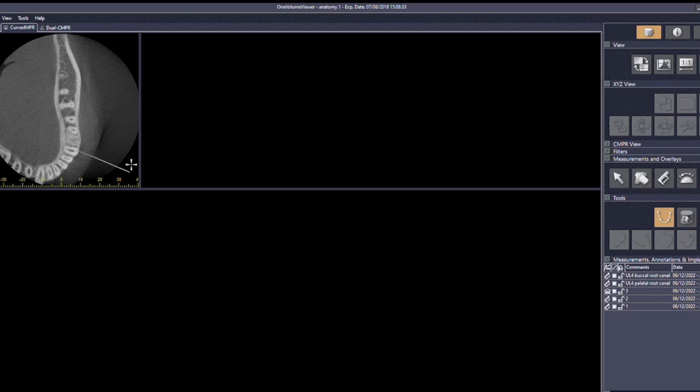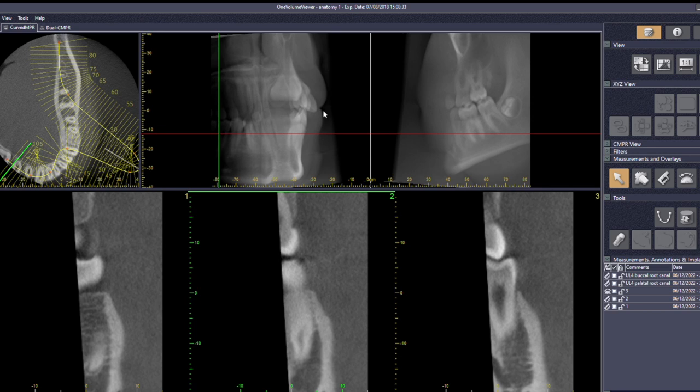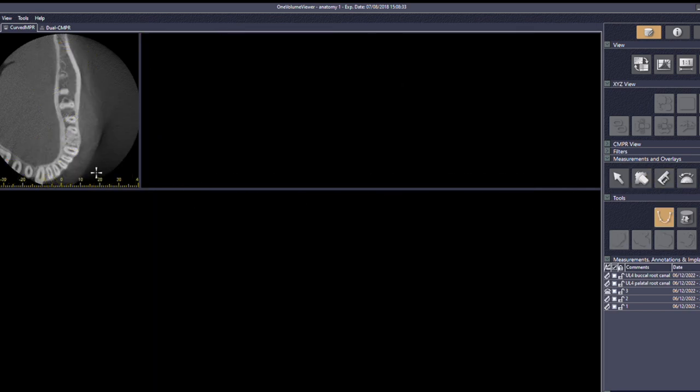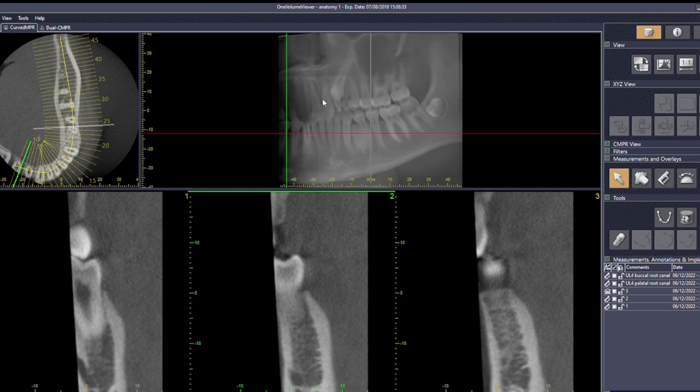You can't come out here. It won't work. You'll just get from here an area of no data here. So you've got to stay within the data set. So let's delete that one again. And do one more time here. Click, move, click, click, click, click. Double click to finish. Goes back to pointer, and then we get this nice view.